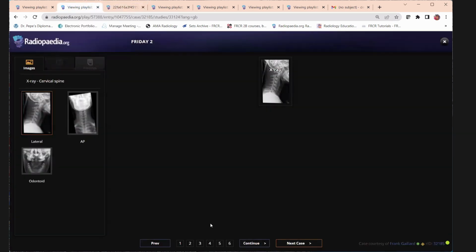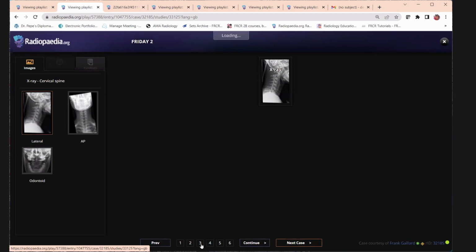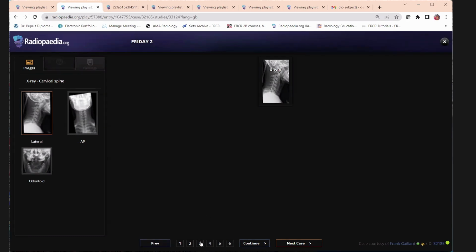You did not say anything in the MRI about the interspinous edema. So if you are seeing this much big separation of both the spinous processes, you would definitely see an edema. I would show you the CT just to show you that.